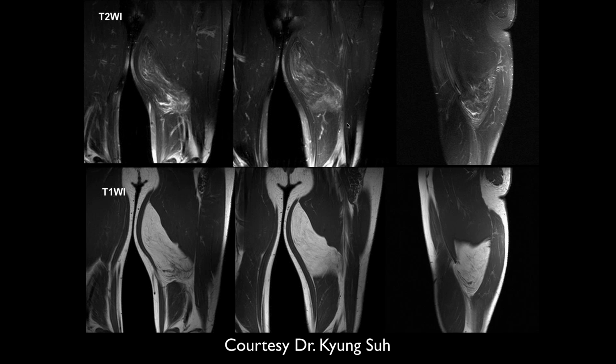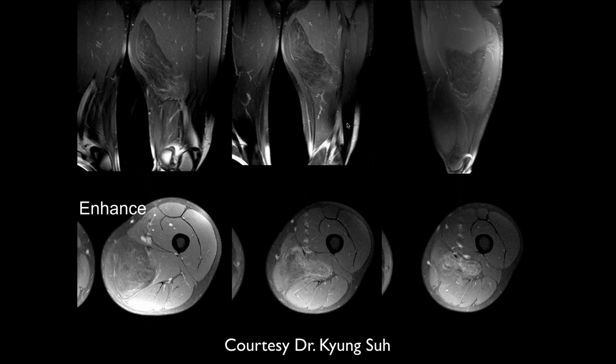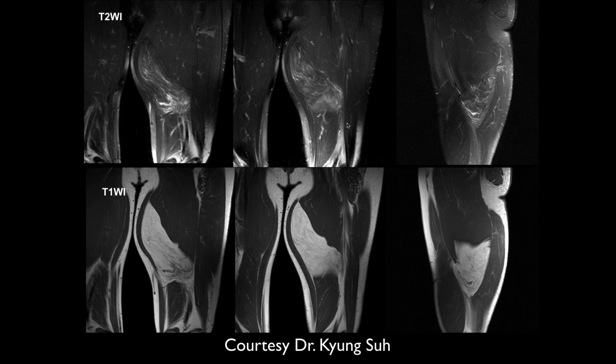Yeah, so the entirety of the lesion doesn't suppress out. So this is a fatty lesion, but I wouldn't really just say that this is a benign lipoma. The septation inferiorly is a little suspicious. They were concerned about this also. They excised it, and it was completely benign, even down there inferiorly. So, you know, the literature isn't entirely clear, but if you have septa that are thicker than 2 millimeters, or if you have a nodular type septal thickening, then you have to be concerned about the increased risk for malignancy within the lesion. Yeah. So this would be one that would be considered suspicious.